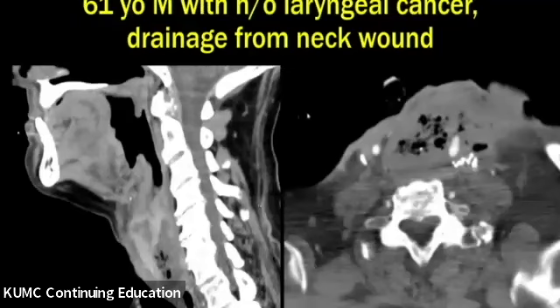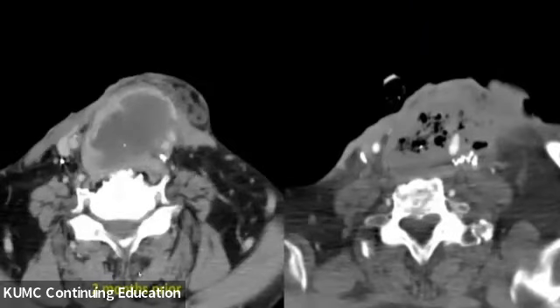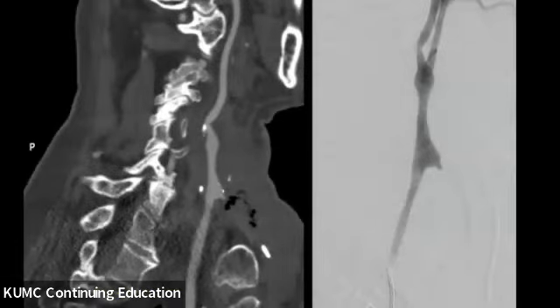A 61-year-old male with a history of laryngeal cancer now has drainage from his neck wound. We see a large necrotic laryngeal mass, at least partially encasing the left carotid artery. Comparing to the exam from 2 months prior, we see new luminal irregularity and focal outpouching of that left carotid artery at the level of the necrotic mass. The CTA MIP image confirms that area of pseudoaneurysm, and then also on the diagnostic angiogram.